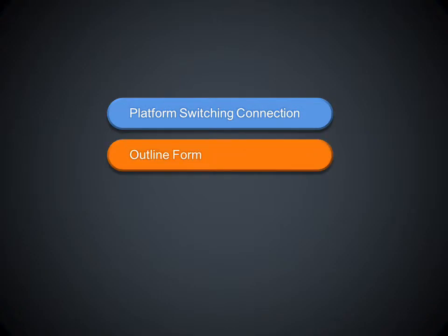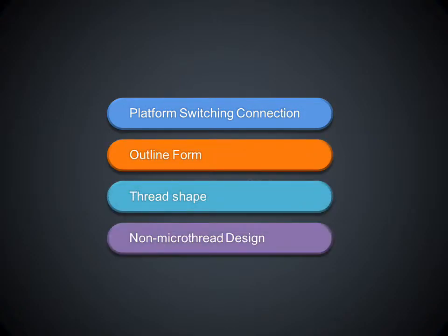Introduction of INNO Implant Fixture Design. Platform switching connection. Outline form. Thread shape. Non-microthread design.